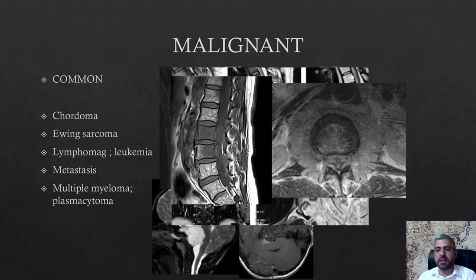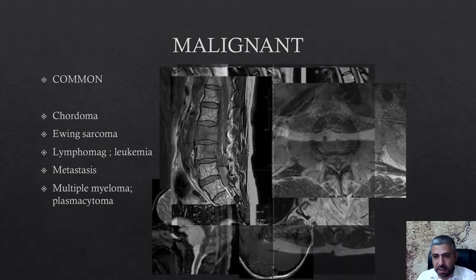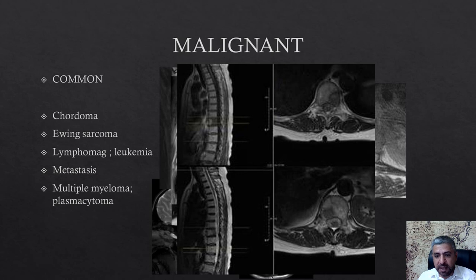One of the commonest lesions that is seen in the vertebra is metastasis. So metastasis, you always put metastasis in the vertebra. Don't forget metastasis in a vertebral lesion. There are typical sites of metastasis, usually involves the pedicle of a vertebra, can be solitary, can be multiple metastasis. You can see here and there. These are metastatic lesions, can be solitary, can be multiple. There may be a known primary or unknown primary.